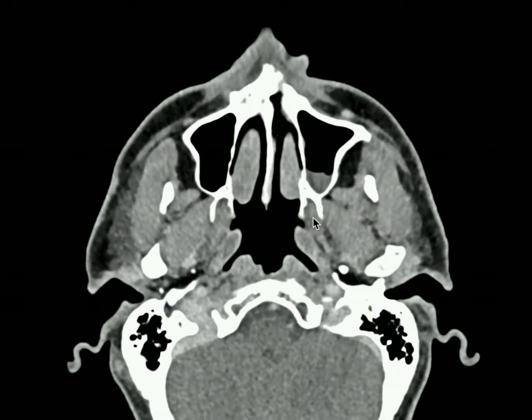Here on an axial CT, we get a good view of the lateral walls of our nasopharynx. The lateral walls are formed by the eustachian tube orifices lying just anterior to the tubal tonsils, by the salpingopharyngeal folds here, and by the lateral pharyngeal recesses, also known as the fossae of Rosenmuller. On this image, we also see our nasal septum, the posterior and inferior portion of which is formed by the vomer bone. We see our inferior nasal turbinates, our maxillary sinuses, and the pterygoid plates.